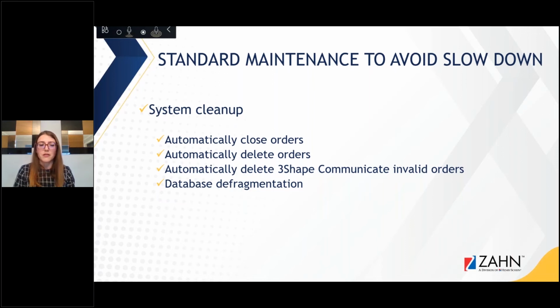and it's not gone, especially in the newer versions. You know, there's an advanced import option where you can manually bring in the case. So even if it's a good case and deleted, you can always bring it back, thankfully. It's a great feature, and I absolutely love it.